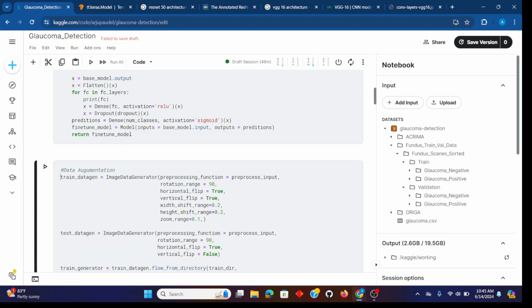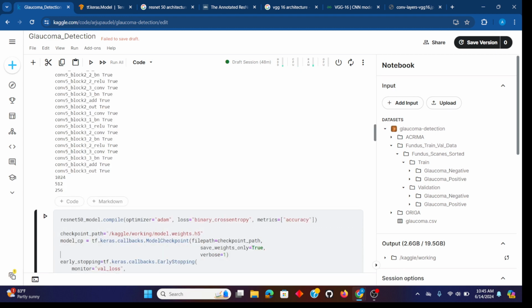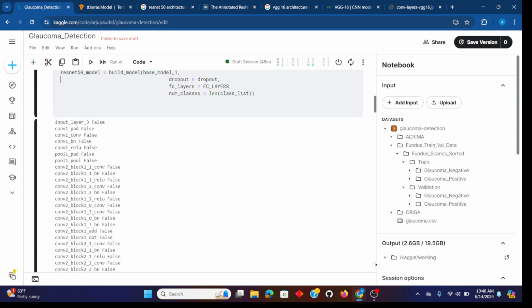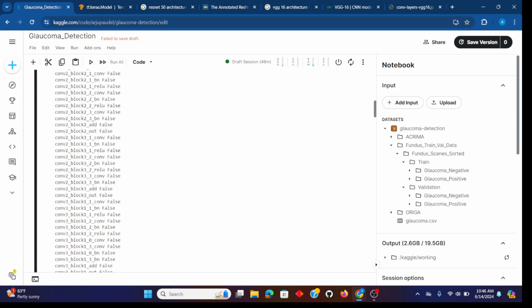And I'm returning these, not a variable, but the class objects in this class. So I'm returning this, and I'm getting this when I call the function, isn't it? What I'm getting there is this model. Our model is ready, isn't it? So we can use it.